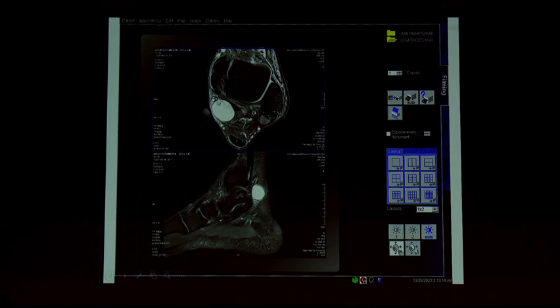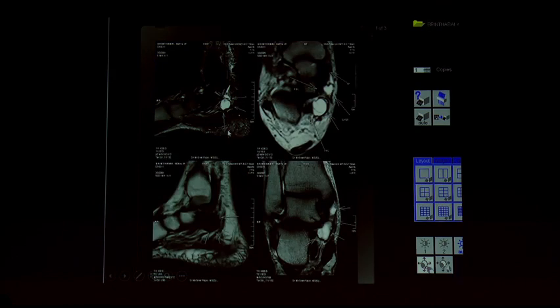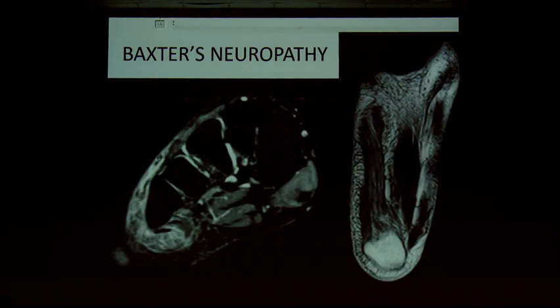It will produce a compression over the nerve, so between, you can see the FDL and FHL. Between that, the classical location, ganglion cyst, see the nerve is compressed and displaced anteriorly. Nicely, you can see the tip of the nerve over here. And sometimes rupture of tendon will produce bursa, it will produce mass effect. This is a classical location where tarsal tunnel syndrome occurs.